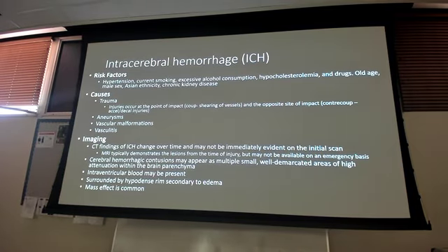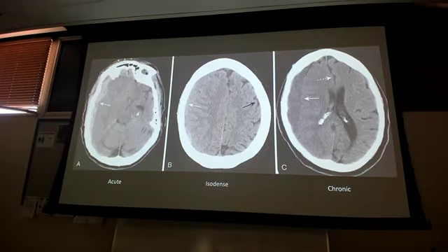There are different types of hemorrhages that you're going to be able to diagnose specifically based off of symptoms and the way the CT looks. But before we go there, let me go back to this. In Alpha and Charlie, which side is the bleed on?